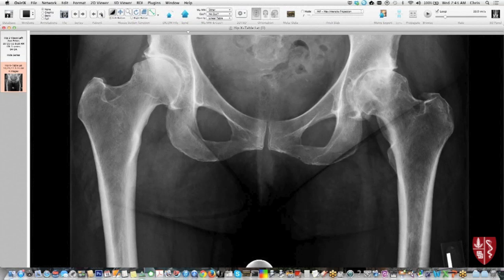Take a look at this example. So this is kind of classic board 101, right? Here's a patient coming through the orthopedic clinic, and this is a fairly classic manifestation of osteoarthritis, right? On the right side here, you have asymmetric narrowing of the cartilage space. See how it's thinner here than here, maybe a little bit of osteophytosis here and here. That side's fairly mildly degenerated. On the left side, it's quite severe, right?